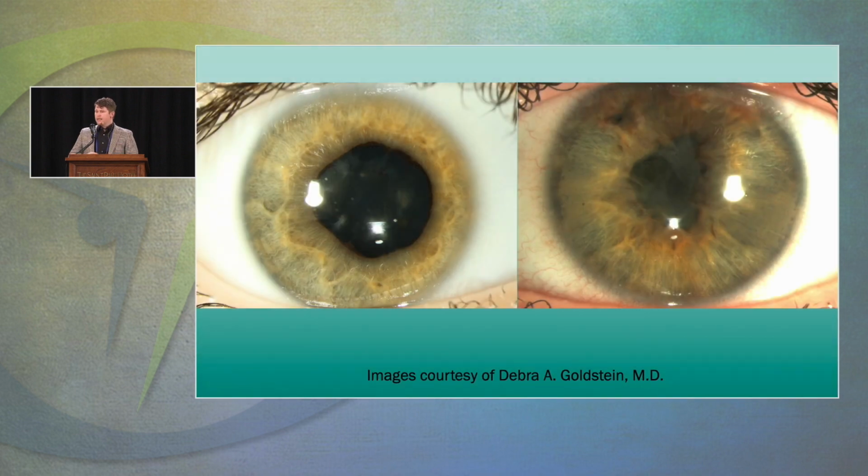So pediatric uveitis is scary. These are photos from my mentor, Dr. Goldstein. I want to just show you that the right eye here is not as bad as the left eye, but I don't like seeing this right eye, this patient's right eye, either, so it's the one on the left on our screen. And we'll zoom in and I'll show you why.